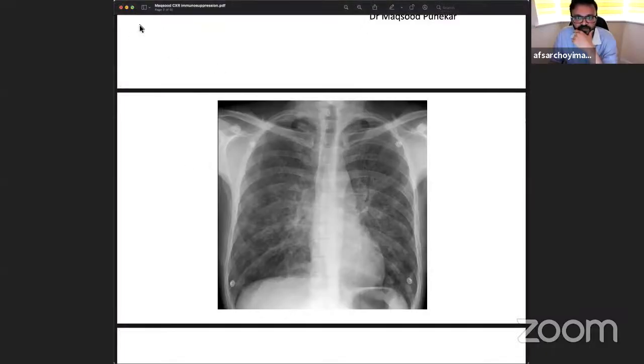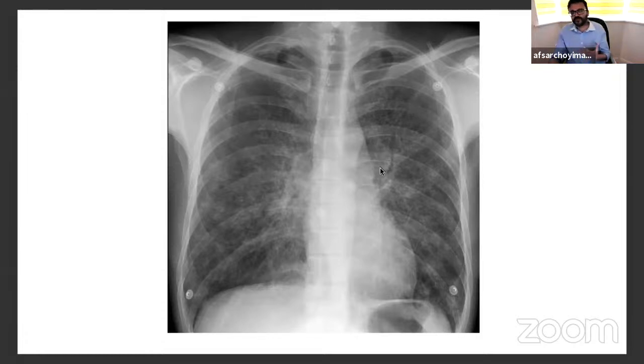Right. Okay. So whenever I look at an X-ray, straight away I first stare at it for a few seconds. Usually we see the findings straight away, and if you can't see them, then you start from one end. I always start from below the diaphragm. Below the diaphragm, you look at the costophrenic angles, then go behind the heart and come up to the hilum and go up to the lung apices. Then I go through the rest of the lung fields, then go outside. That's how I usually go.